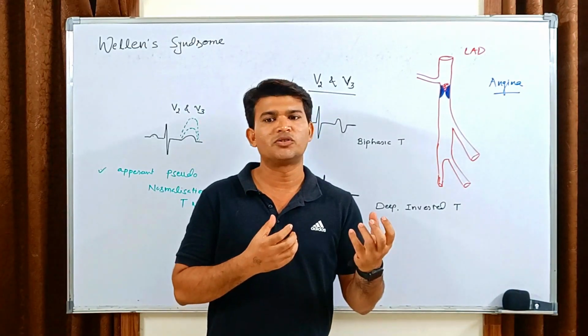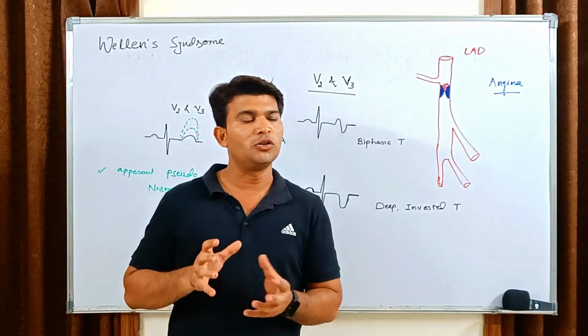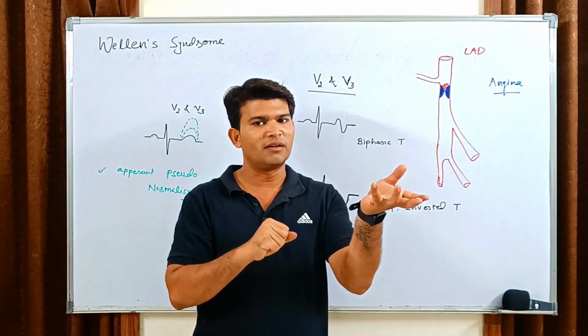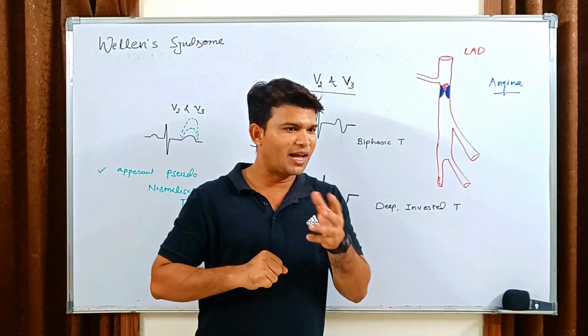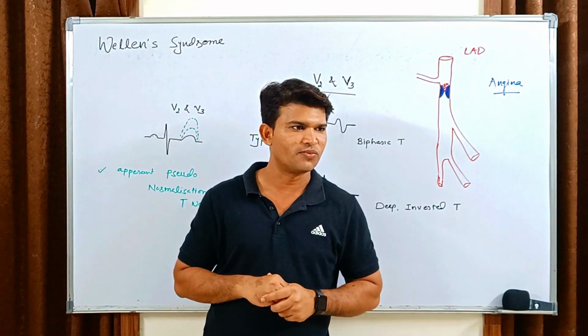If the patient develops myocardial infarction, hypokinesia is there, then 2D echo will reveal a hypokinetic heart. But before that hypokinesia develops, we want some sign or proof, right?